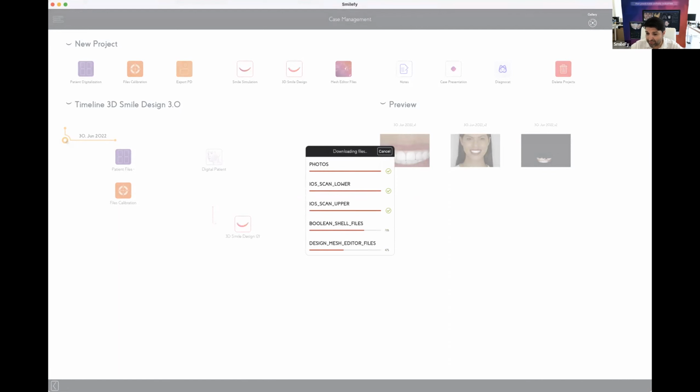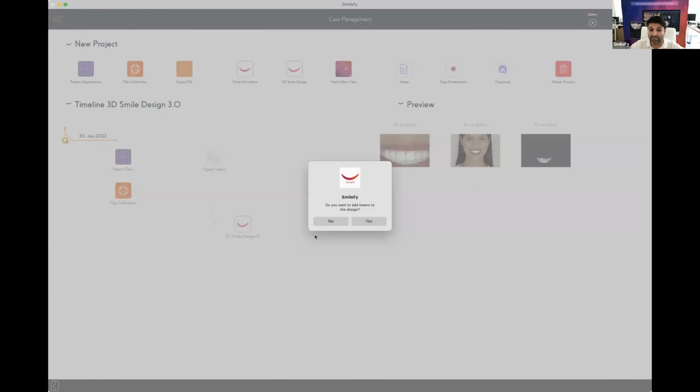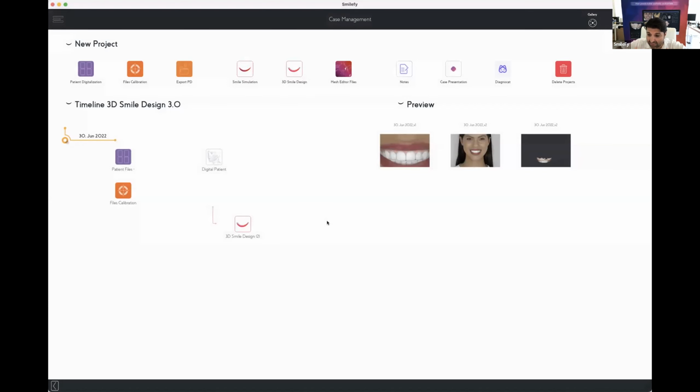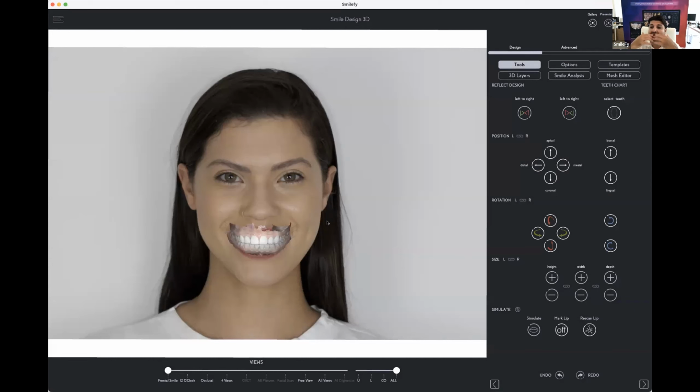So Gabriel, did I answer your question? You can add a palatal stabilizer for the shell mockup. The answer is yes. You design, and you let the incisal edges stabilize over the incisal edge of the tooth, then you get the mockup perfectly matching the patient's teeth, right? And then you can get this stabilizer. The shell mockup is very powerful when you design a crown lengthening case and you need to go over the gingiva. Then you can simulate how far you can go with the gingiva.